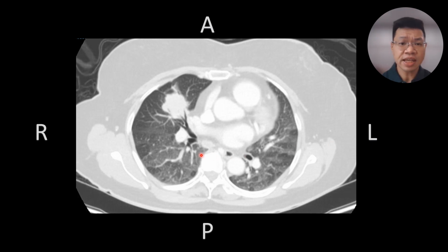We can thus see that the branches of the middle lobe appear as tubes which travel in a posterior to anterior direction. Hence, by sectioning it perpendicularly, we should use the coronal CT to visualize the tubes as circles.